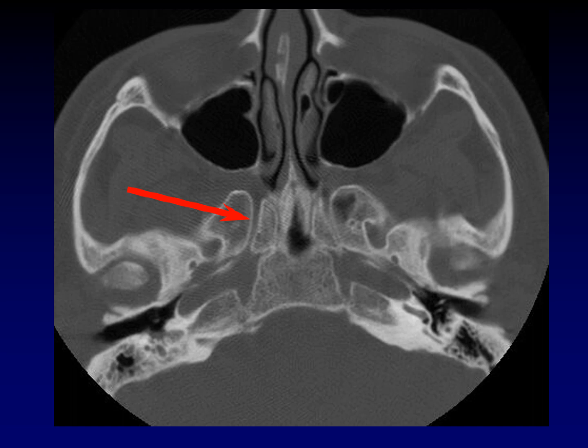Let's look at those same canals on axial plane, right? I'm going to show you Vidian's canal and I'm going to show you foramen rotundum. Vidian's canal is long and thin and it leads right into the pterygopalatine fossa. So is this the pterygopalatine fossa? Yeah, we're right posterior to the center of the maxillary sinus. There's the pterygopalatine fossa, and leading right into it is this long, thin object. That is Vidian's canal.